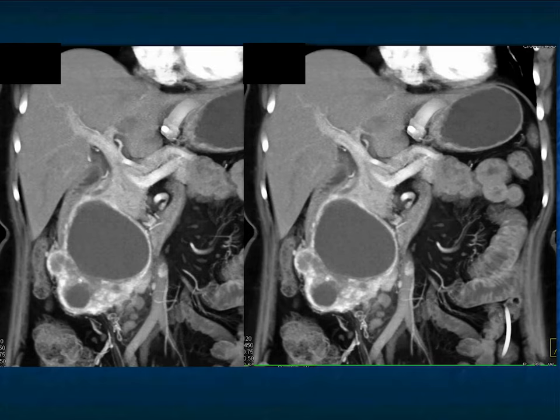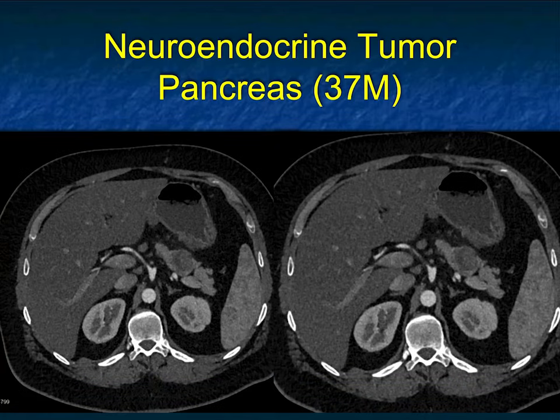So again, you're not going to consider a solid serous adenoma, but you could say, well, could this be a serous adenoma? But there's too much nodularity in the inferior aspect. I would worry, could I be dealing with an MCN? Cystic neuroendocrine tumors are a really good bet.